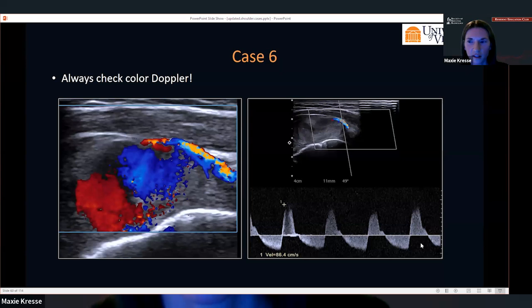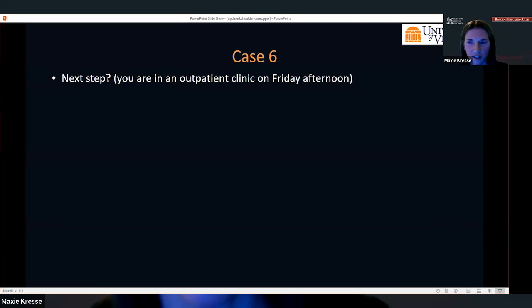Okay. See a couple of them there. Okay. I'll give you some more imaging here. We'll see if this helps. So a couple of people are onto it.